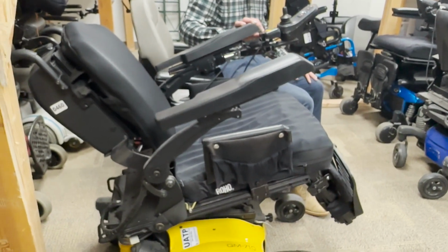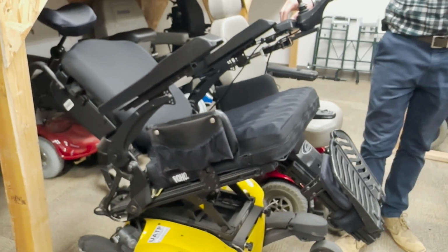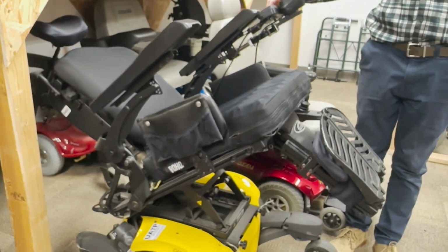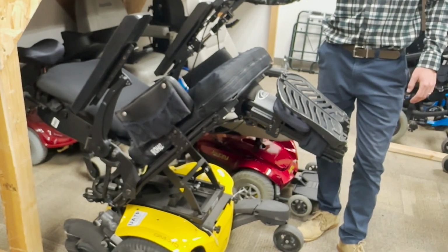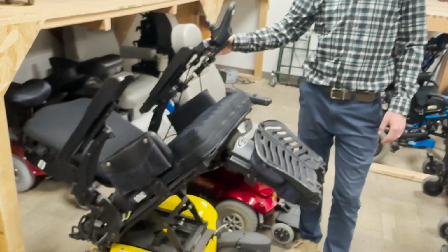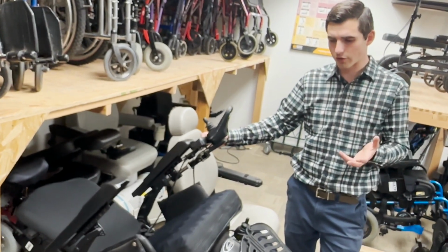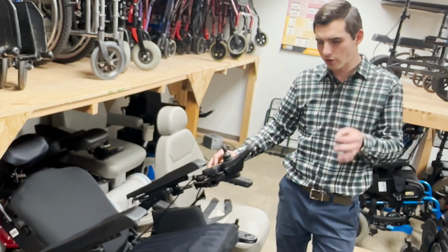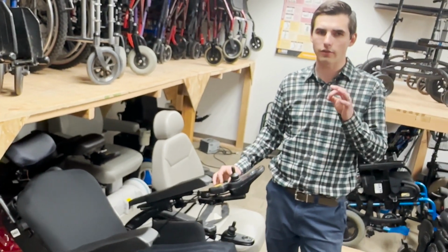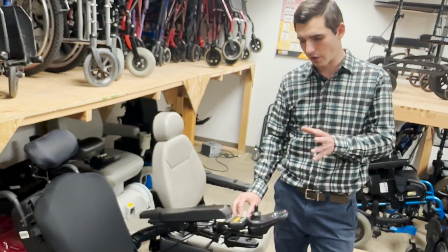This one's called tilt. So all the angles stay the same, but everything is just rotating. In casual terms, some people call this stargazing mode. The point of this is very similar to pressure sores, or bed sores. Pressure sores are developed because you have constant pressure. It's not a large amount of pressure, but the key thing is it's constant on a particular area that stops blood flow from reaching that area.